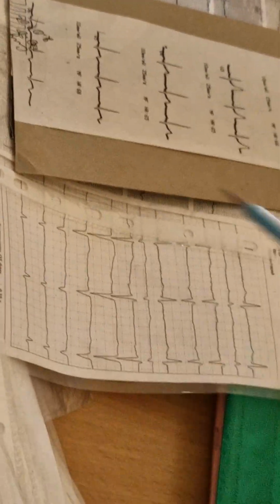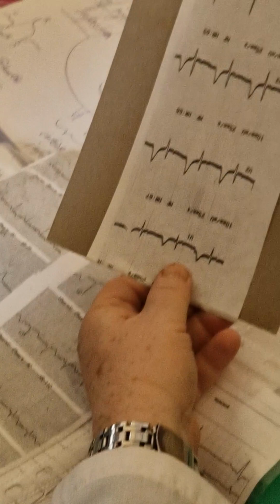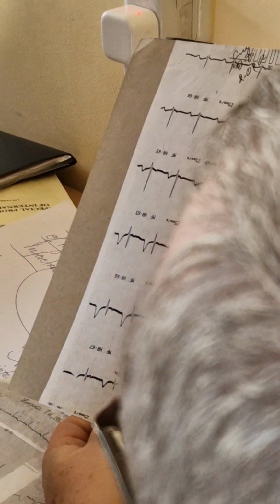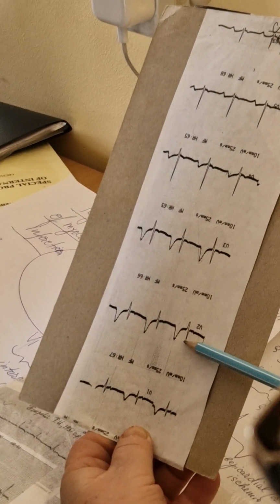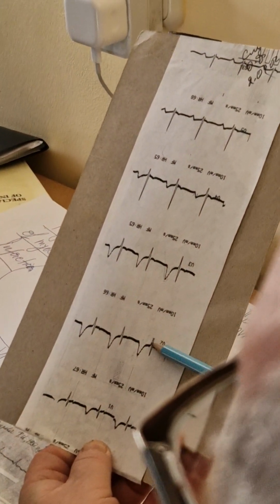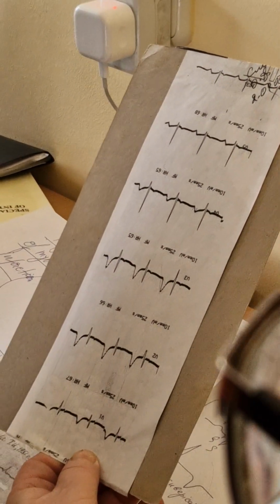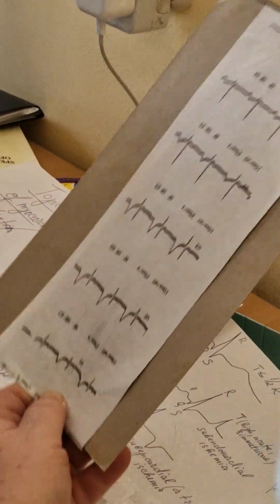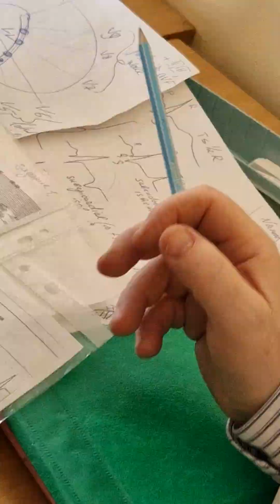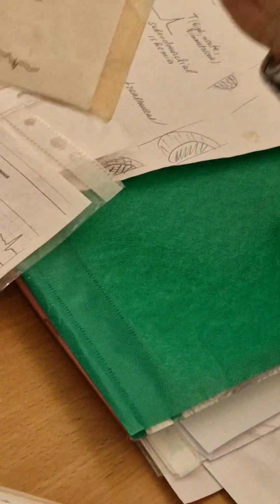Here high T wave. But if you overturn, what do you see? If you overturn, like in mirror, Q wave, R, T negative, in opposite leads. Doctor, wait. So show again.